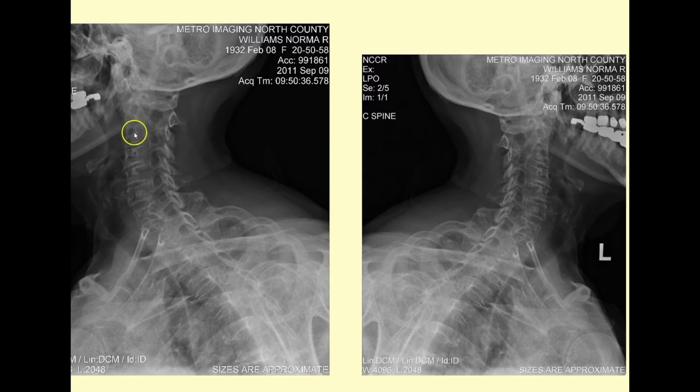Here at this level, and this is the 2, 3, 4, 5, 6 level, we have both facet hypertrophy or facet arthrosis intruding into the intervertebral foramen, but we also have part of the Luschka complex intruding in. And remember, the nerve roots come out right below the superior pedicle in an IVF. So it's possible, at least, that this patient is demonstrating some segmental sign and symptom. Now, this does prompt me to share with you a common mistake.